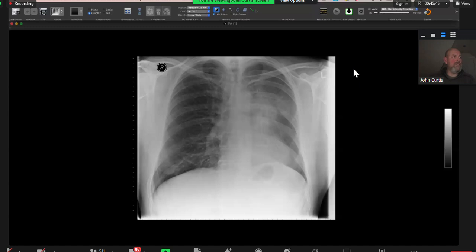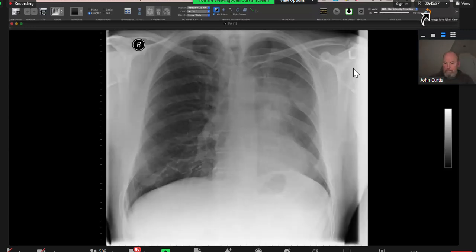This patient is complaining of a cough. Yes, I have been presented with a frontal chest radiograph for an adult patient with history of cough. I can see that there is decrease in the size of the left lung in comparison with the right lung. I can see that there is a mass lesion noted in the left hilar area, causing a veiling sign of the left lung and also causing crowding of the ribs. Appearances are those of left lung upper lobe collapse, mostly due to the mass lesion.